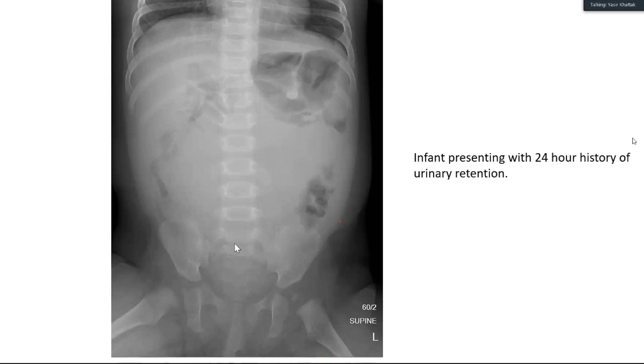So now, until now, you see we are still sticking to the main single finding that you have explained. We still have not finished. Then you can mention very shortly what the other things look like, the rest of the bones and the soft tissues, and then you come up with a differential diagnosis. So this is a lesion which you think, what would you think this could be in a child or an infant? Sir, the skeletal immature patient, so it could be of kidney origin or adrenal origin, neuroblastoma or Wilms tumor could be two differentials. Okay, what else do you want to do for this patient?